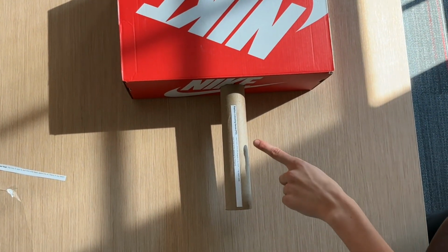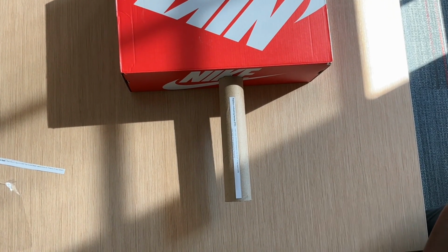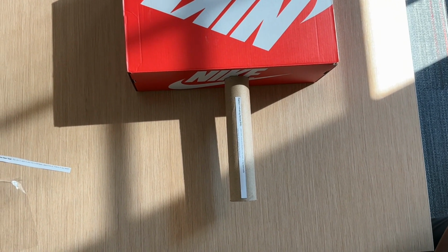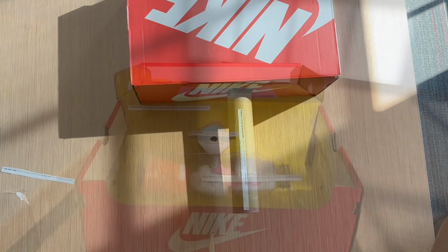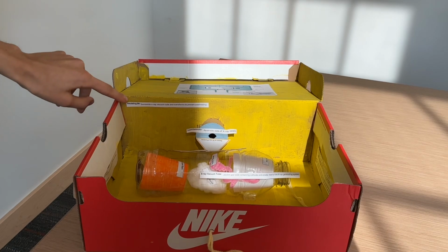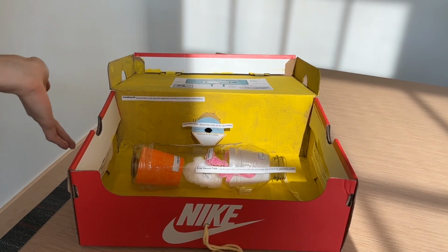This is the PID, and it is lead lined, aims, and shapes the X-ray beam. The X-ray beam exits the tube head at the opening for the PID. All this yellow is the insulating oil that surrounds the X-ray vacuum tube, and it transfers heat to prevent overheating.